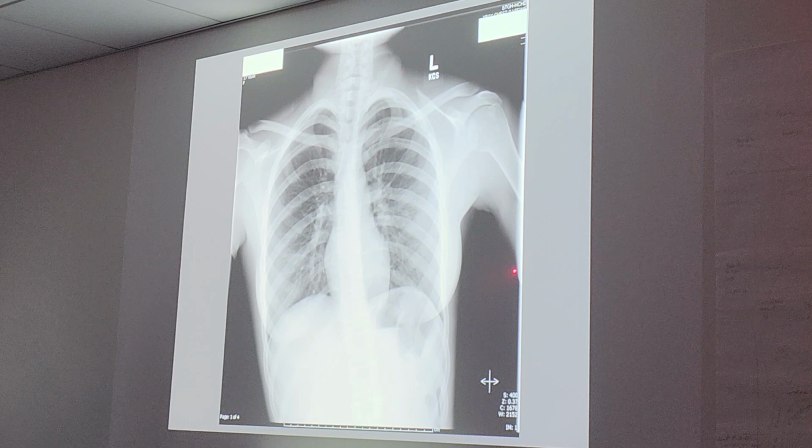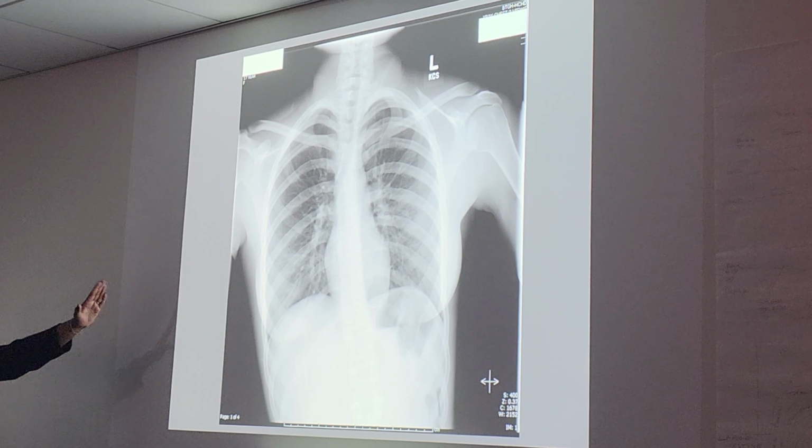So are they shifted to the right? They're definitely tilted to the right because you can see that their lungs are over to the right. The bottom half is going to the left. And if you take a look at the lumbar vertebrae here, it's tilting to the left. So there's tilting to the right on the torso and on the bottom tilting to the left.